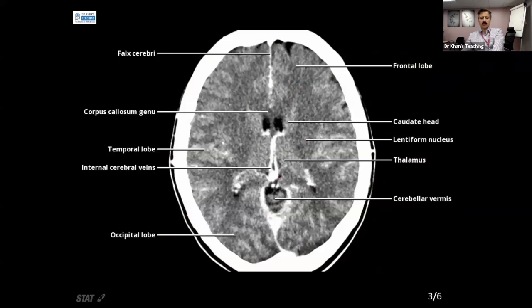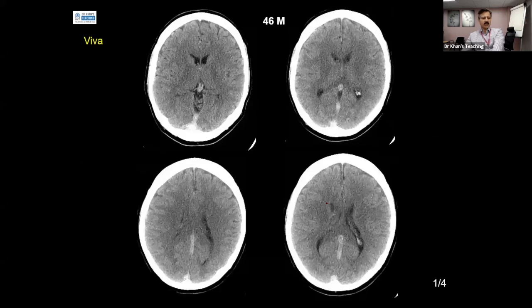where this is a repetition of what you have just learned on MR. Thalamus here, internal cerebral vein. This is with contrast, and you can see the anatomy very well if you know the concept. Now, this is an exam case. Because of a time factor, I am not going to give it for the Viva. But this is a classical FRCR 2B Viva case.